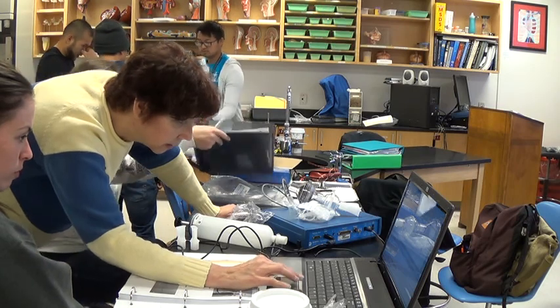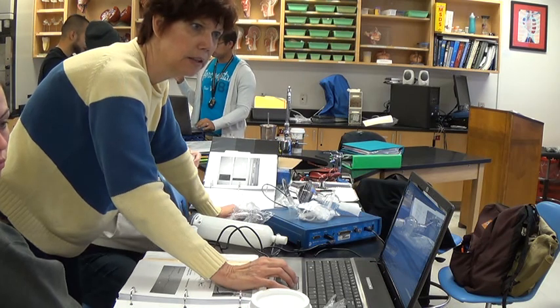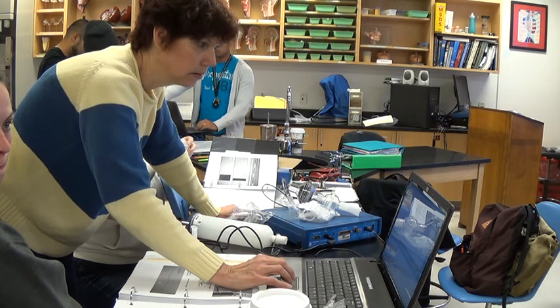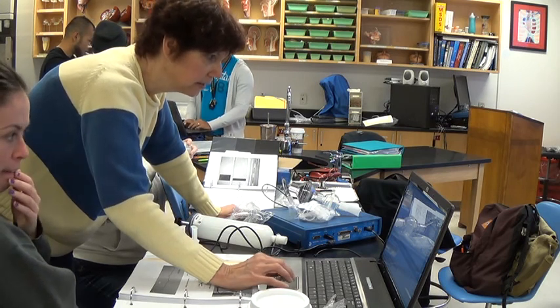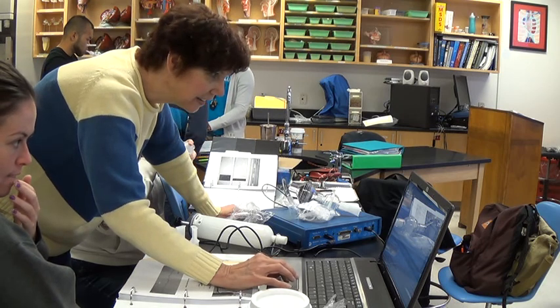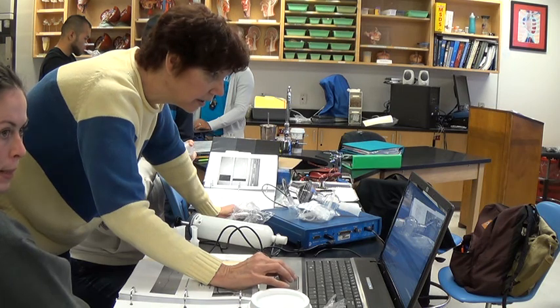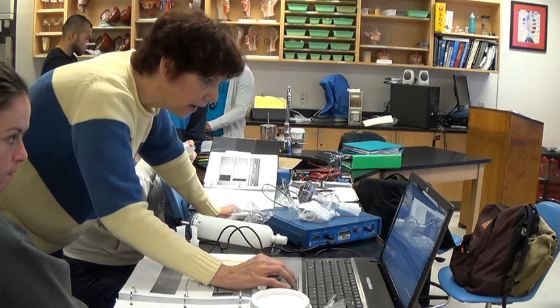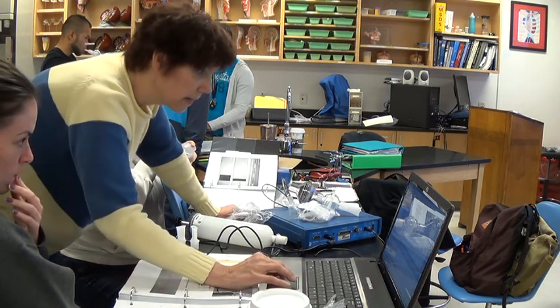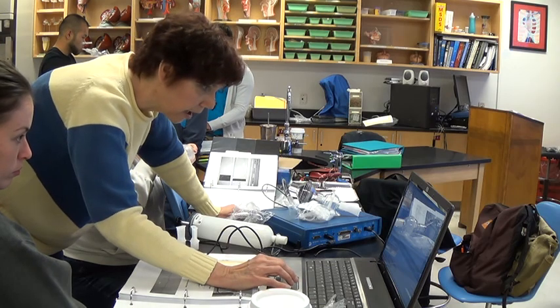Did you guys do redo between individuals? We didn't end up having to because it said redo calibration, so it already had calibrated. It just popped up. It had the option to record or read from another subject, so we said yes, and it was already up there reading calibration. Well, you should just be able to go to lessons again and start over, and not have to calibrate.